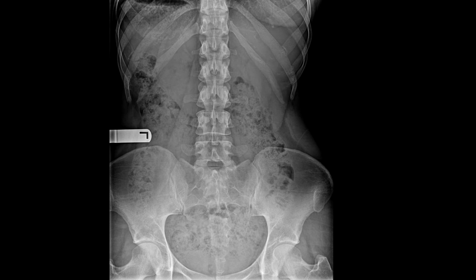Alright, so let's take a look at a frontal lumbar film. Normally, you do not see the gallbladder unless there's something wrong with it. It's going to be in the right upper abdomen, right middle abdomen, tucked underneath the liver. When there's gallstones inside, they're going to usually settle on the inferior aspect of that gallbladder, and if there's complications, the gallbladder can swell, cholecystitis, blockages, all kinds of things can go wrong.